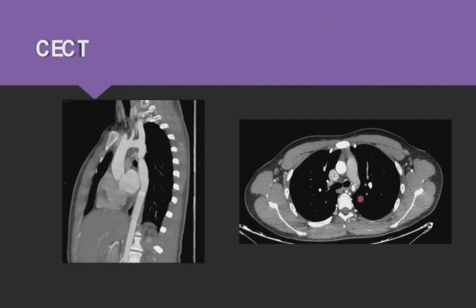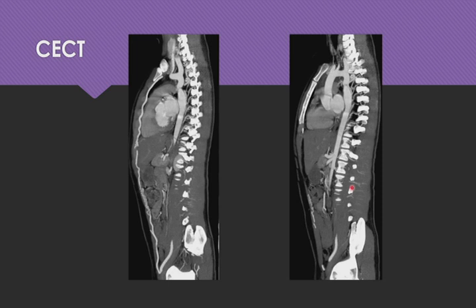And we can visualize it better in this axial view. This is the site of the narrowing. Also, in maximum intensity projection in oblique views, we can identify this dilation of the internal mammary arteries, which distally connect to the external iliac arteries. And we can also identify dilation and vessels with tortuous configuration at the intercostal arteries.